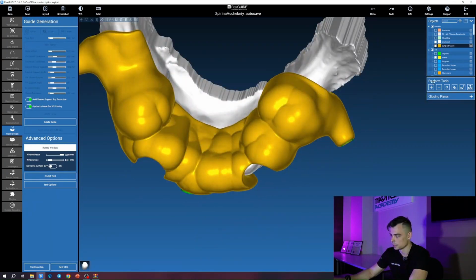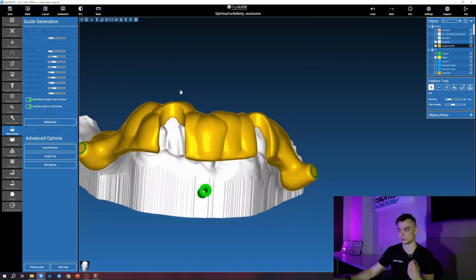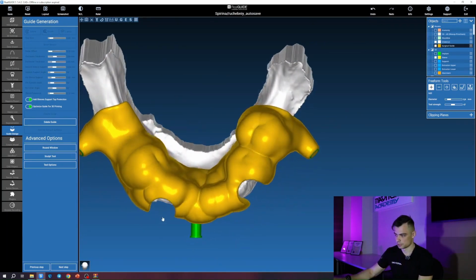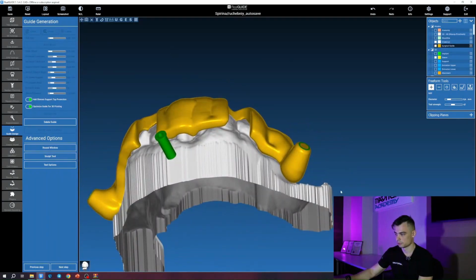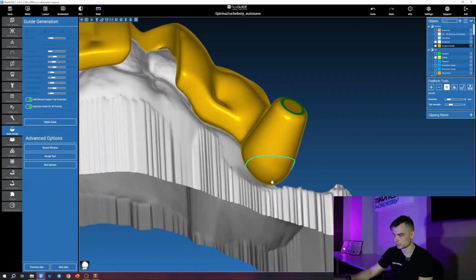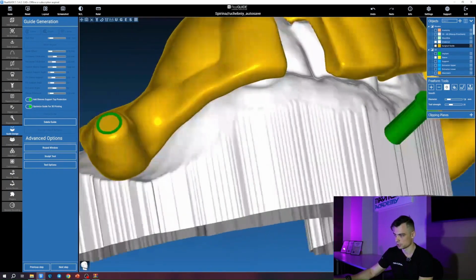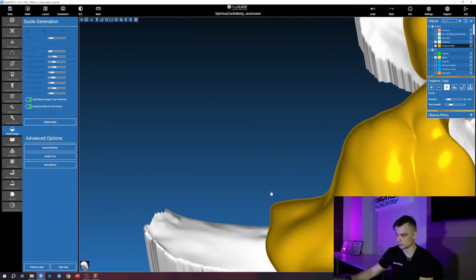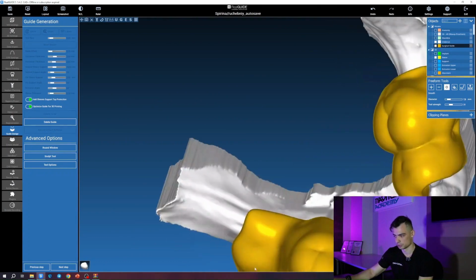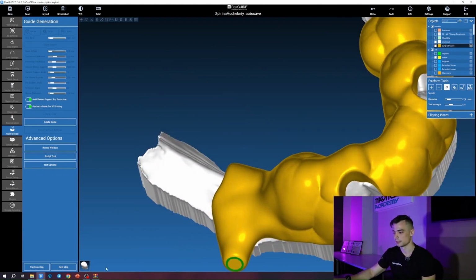That's it. Well, in the window area, we also usually add a little plastic so that the design of the template does not suffer. That is, God forbid it does not break or anything like that. That's all. Everything is fine. Nothing is interfering with anything anywhere. Here too we'll trim a little bit because it might come into contact with the mucosa. Well, if anything, it will just press against it. Nothing bad will happen. But still, just so as not to stress yourself or others, it's better to remove. Okay, we click next step.